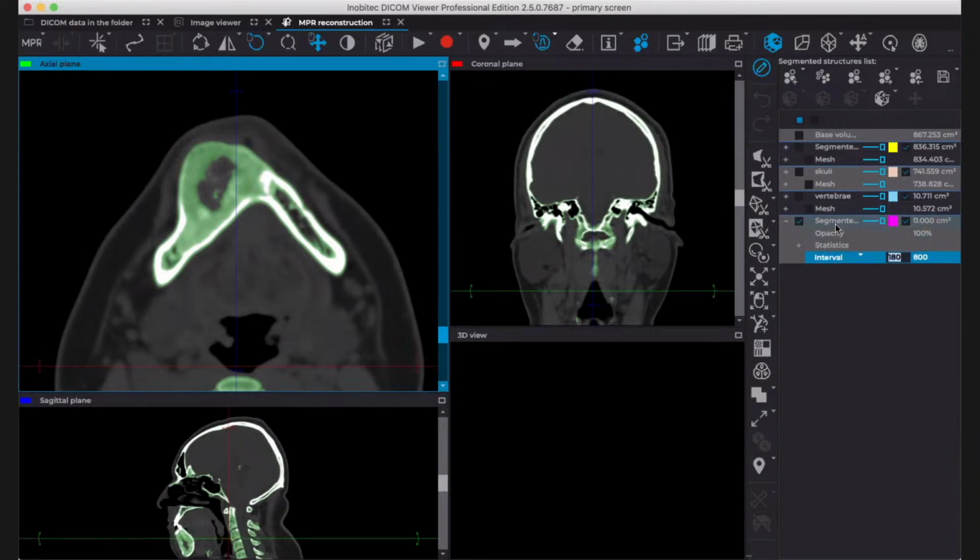You see I came here to my segmented structure. I will be modifying the mask now. And I can select here, what I did was to activate this little tool here. I will select 210 and check how it looks like. Oops. I have still the tool remote.